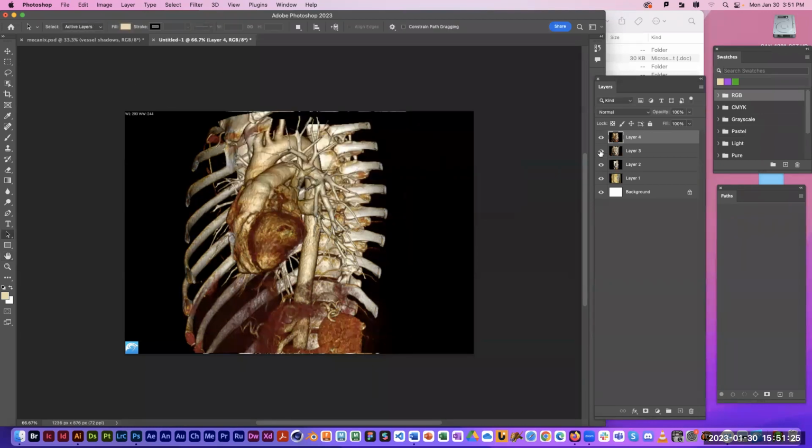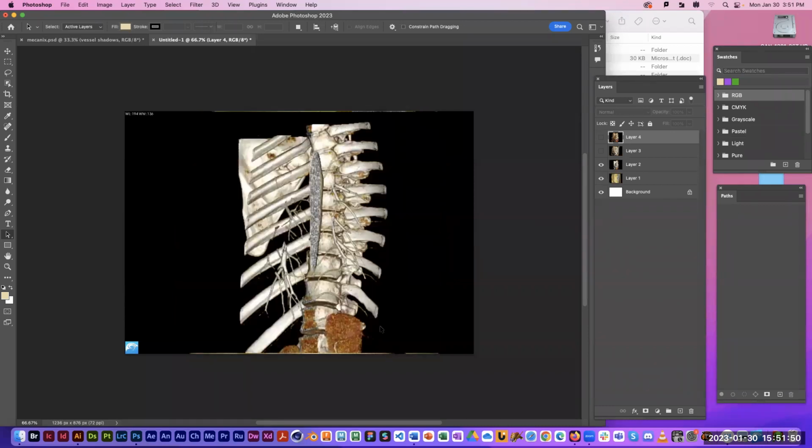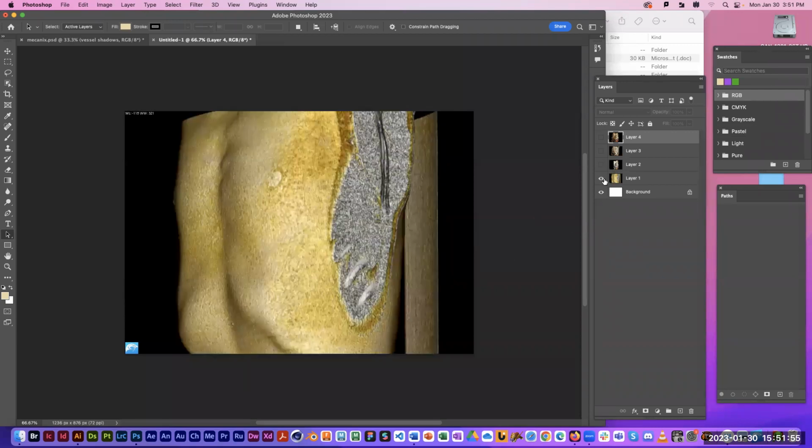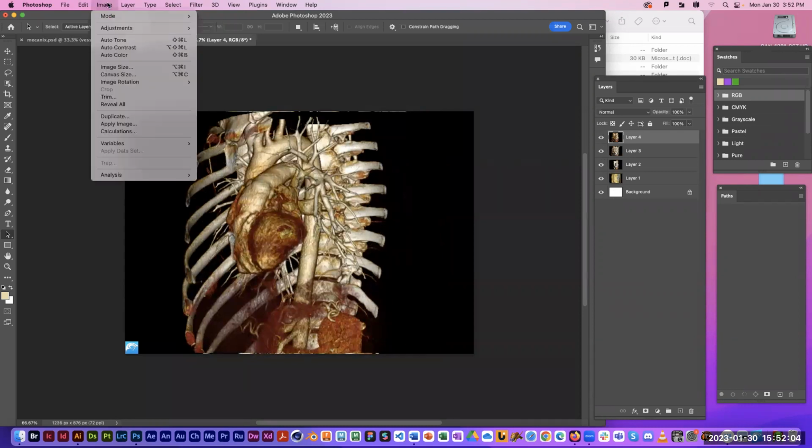This image probably will work best as a vertical image. I don't know. It's really kind of close. I could make it landscape view like this. Yeah, I guess I'll leave this as a landscape view, where it's wider horizontally than it is tall. Some of these other images look like they really lend themselves to more of a vertical portrait view, but by the time I add all that skin outline and stuff, I think actually I'm going to be better off in this landscape view. So I'm going to go back to that image size.